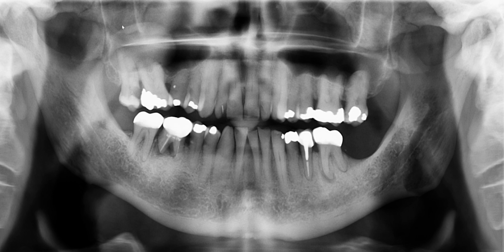right above the roots of, I'm presuming, tooth number 2 and 3, or possibly 1 and 2, depending on whether we lost number 3 previously. Anyway, superior to maxillary right molars, we see this opacity that demonstrates a very smooth outline.